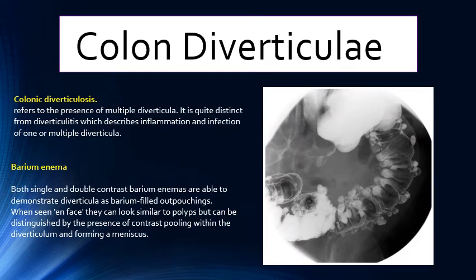Going to the similar, as we mentioned in the esophagus, we have multiple diverticular disease or diverticulosis of the colon. It may appear as an outpouching of this contrast-filled or barium-filled spaces outside the contour of the colon. And here we can see these multiple diverticuli. Here it's not a complicated diverticulum, but if this diverticulum is ruptured, it may lead to collection or inflammation, leading to diverticulitis, where the patient's symptom is usually pain. It may affect all parts of the colon, but usually the affected segment is the sigmoid.